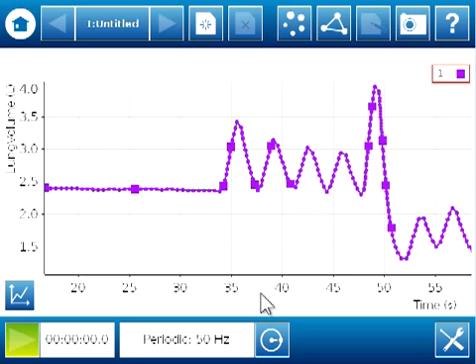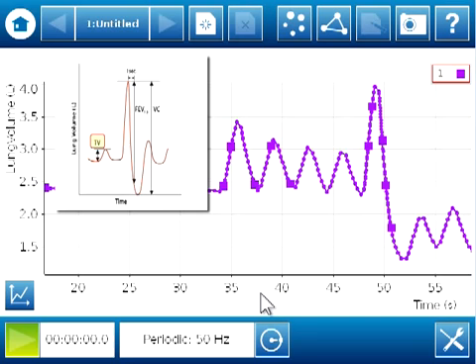lung volume. When I began breathing through the mouthpiece, I took 4 normal breaths, trying to inhale and exhale as I normally would. Following these 4 normal breaths, you can see a more dramatic change in lung volume. We'll analyze that in a little while. Let's first analyze the normal breaths. From this data, we can obtain a value called tidal volume. This is the amount of air moved into and out of the lungs when breathing normally.